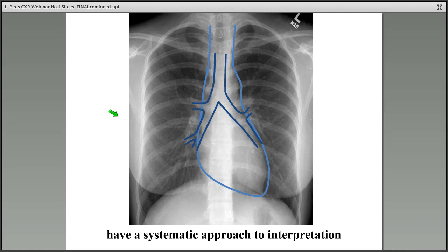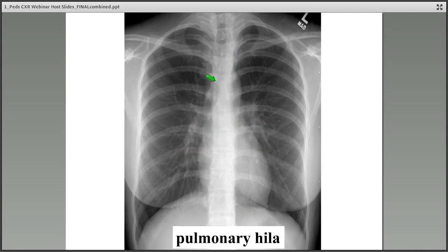In conjunction with evaluation of the mediastinal contour, it's also good to evaluate the airway, to look for bronchial narrowing, looking for evidence of obstruction, etc. And finally, look at the hilar contour. With regard to the pulmonary hilum, the hilar region is composed of both airway and vasculature.